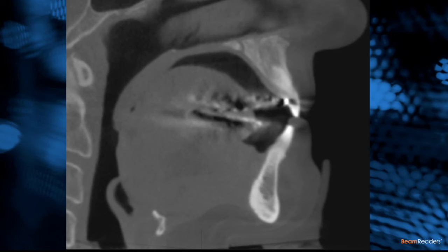Okay, so here's an example, a sagittal view. We have a couple of things going on here. First, here is the chin rest. And if you'll notice, the anterior teeth are separated. So you're going to have to take a look at the posterior teeth to see if they are separated as well. Additionally, the tongue is retruded in the scan. And when the tongue is retruded, the tongue drops back and also changes the AP dimension of your airway.